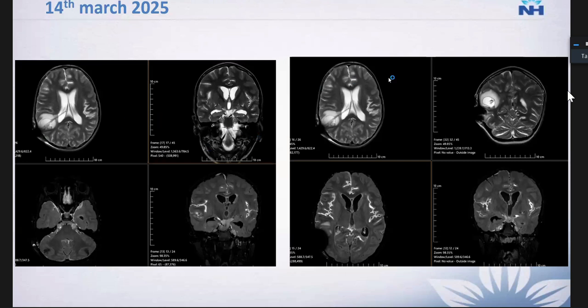At that time, we started noticing that something unusual had flared up in this scan. The basal meningitis has now formed into nodular-looking masses in the CP angle cisterns, and you can see mass-like enhancement in the bilateral CP angles which has progressed over time.